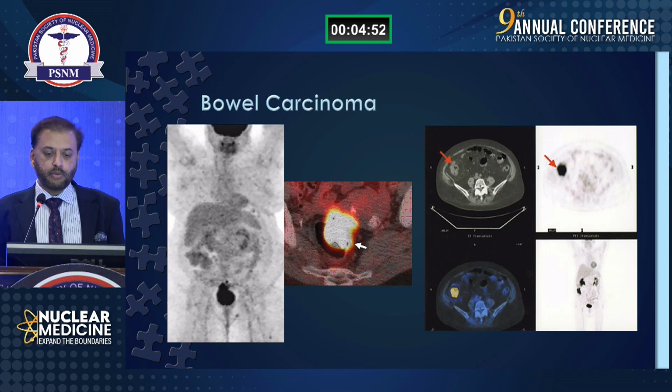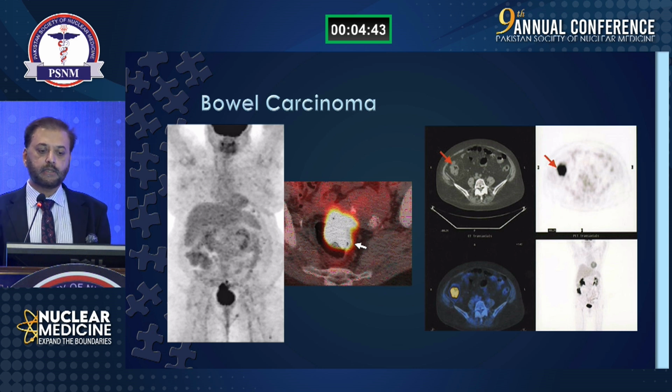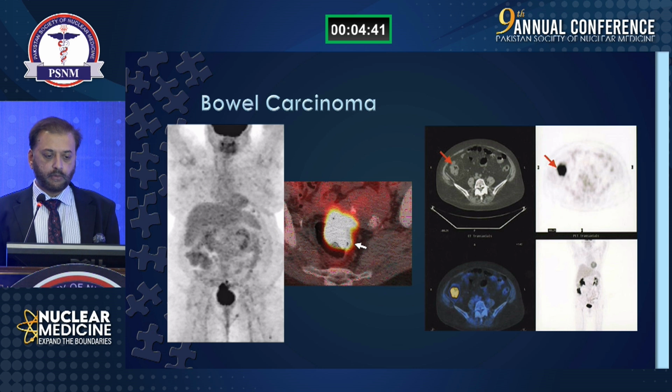This is just to show that the high uptake of FDG can be used when there is a standardized protocol using oral contrast for the intestinal carcinoma evaluation.